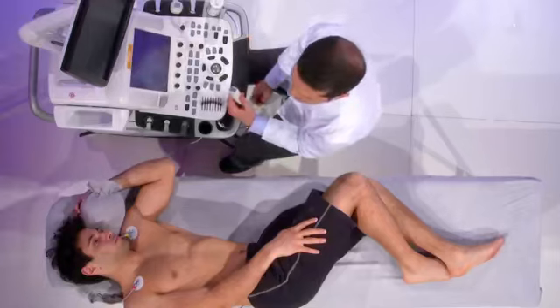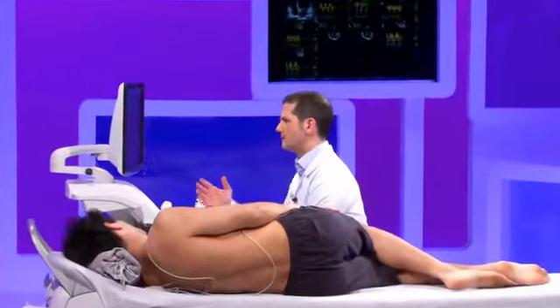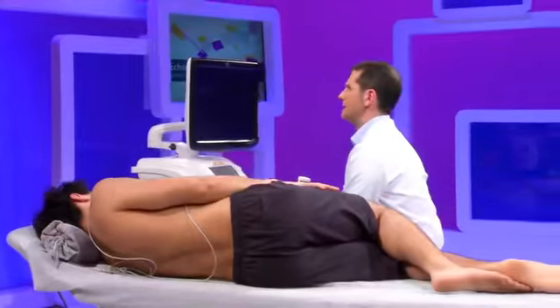The filling pressures are a very important parameter in the assessment of diastolic function because they represent the final common pathway across the progression of diastolic dysfunction, irrespective of the initial etiology. If the cardiac disease is severe enough and long enough, it will lead to an increase in filling pressure, which will give rise to symptoms and will alter prognosis. So it is important to have parameters to use to assess filling pressure.